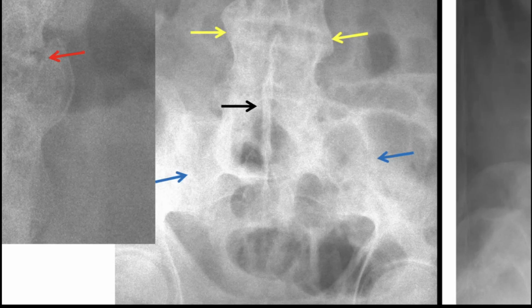So normally you'll have cartilage in that area. You may have ligamentous tissues, for example, in the acromioclavicular joint. Well, they're the two main things really, which give you that density. So, when you get loss of cartilage in a knee, for example, with osteoarthritis, then you get loss of that joint space. And that's why joint space loss per se is a sign of osteoarthritis, because indirectly it signifies to you that the cartilage between those two areas has been lost.